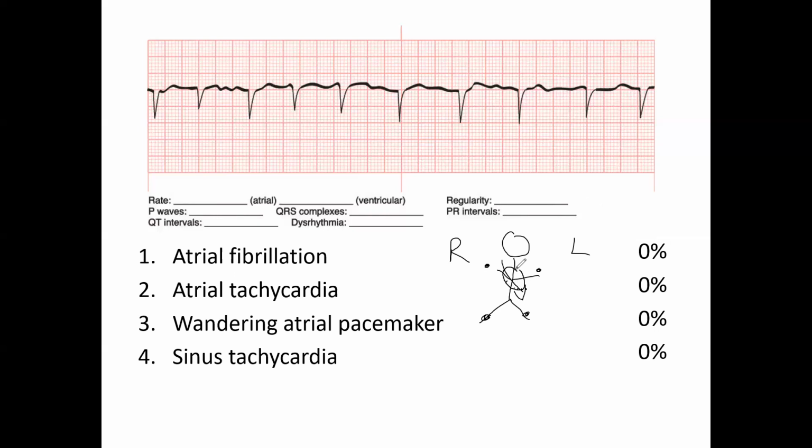If we were to make this aVR, augmented voltage right, then the right arm now becomes positive while the heart serves as a negative reference point. This wave of depolarization moves away from that positive electrode. So therefore we can anticipate an upside down or negative deflection ECG, much like we see up here.